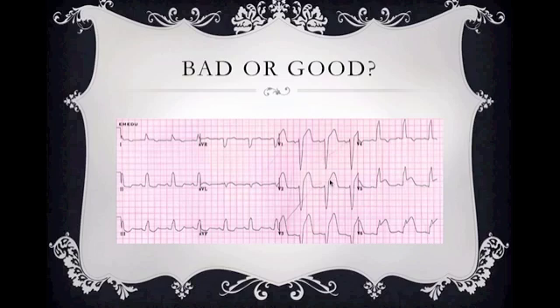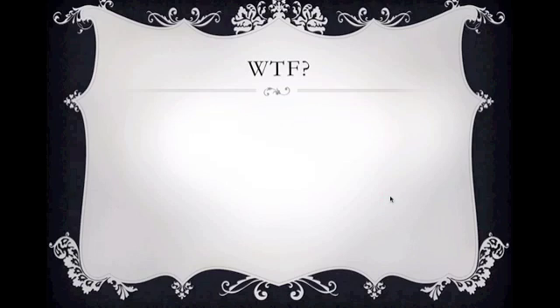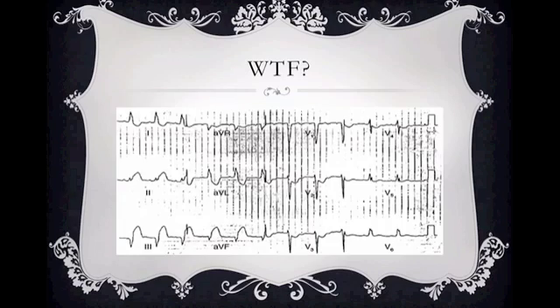Here I have inappropriate discordance. Here, you can really see it there. All right. This patient has had a left bundle branch block with an MI. All right. So that's a classic picture of it. Looking for that concordance.